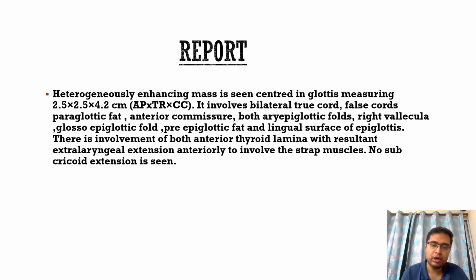So the main important thing to be described in the reports are all the spaces and all the structures of the larynx. So hence anatomy is of utmost importance. So this is a T4 disease, as I had discussed in the staging system.